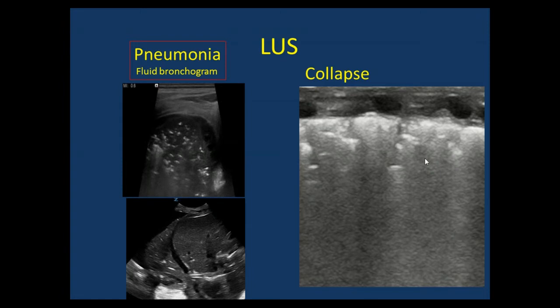And then we mention air bronchogram. When the pleura appears interrupted, not as a continuous well demarcated line, and you have echogenic circles below the pleura, these circles are reflecting air bronchogram, and this is an infant with lung collapse or severe RDS with lung collapse.